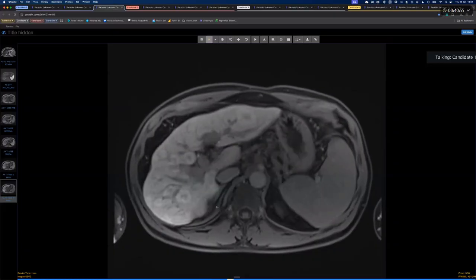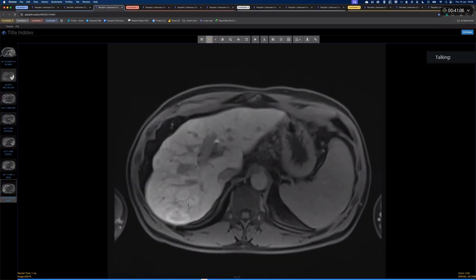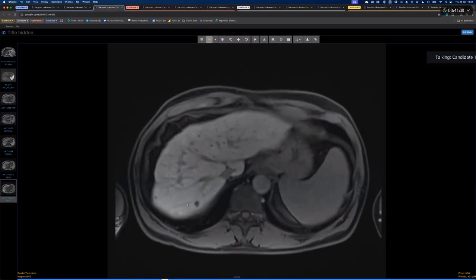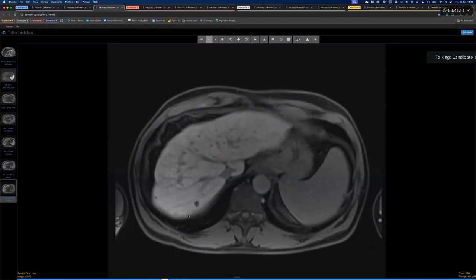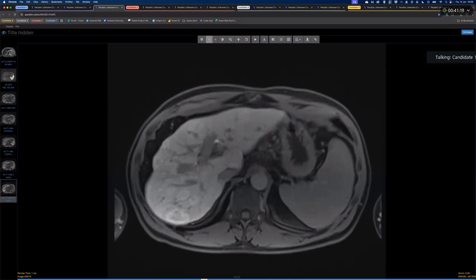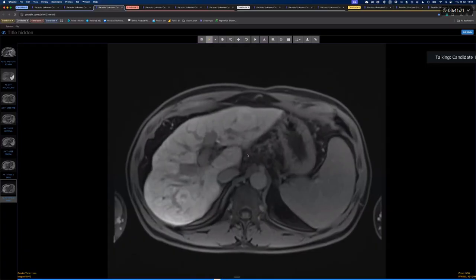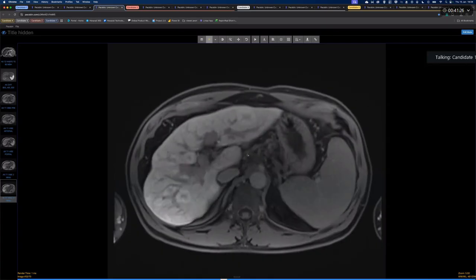Unlikely to be FNH because I would expect the lesions to be iso-intense on the portovenous and delayed phases. Unlikely to be adenomas because these are showing transient avid enhancement, which is not the case. Other possibility, the liver is cirrhotic. So yes, my strong differential is multifocal HCCs.